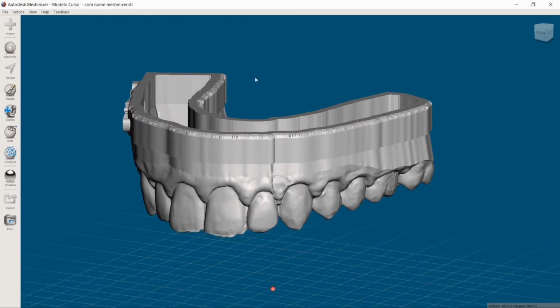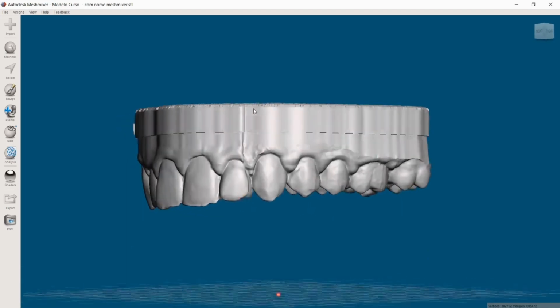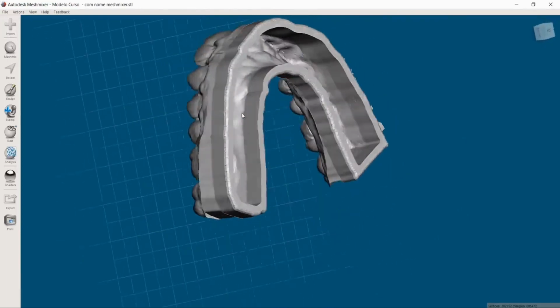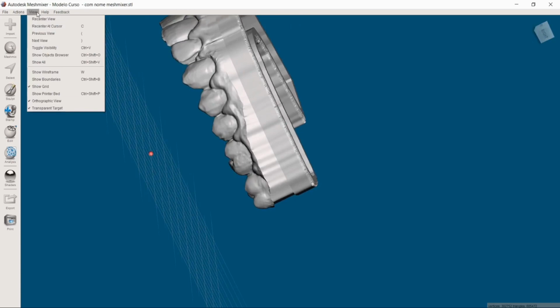Not all courses that show that are difficult, but I learned this only by testing the software a lot. You go into Actions, View, and they're going to put it on the print bed. What happens?